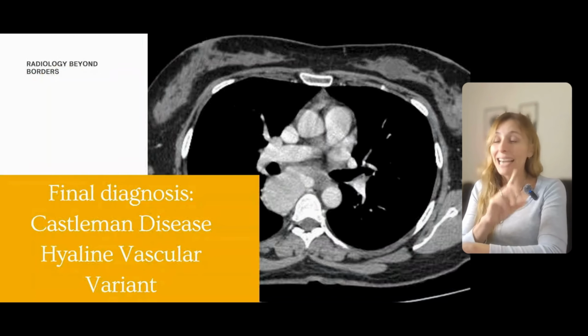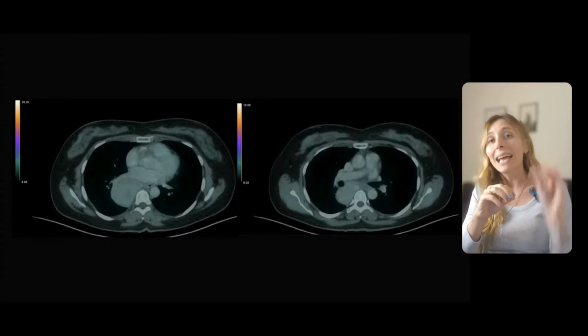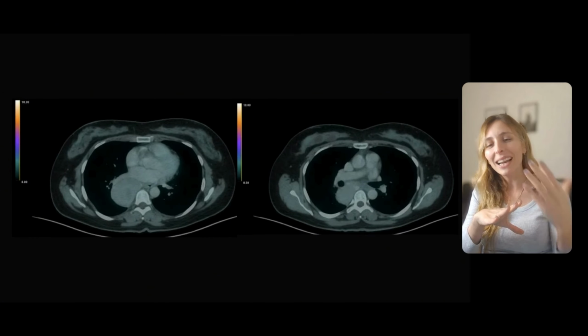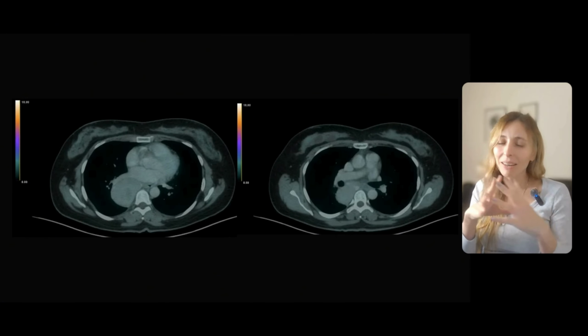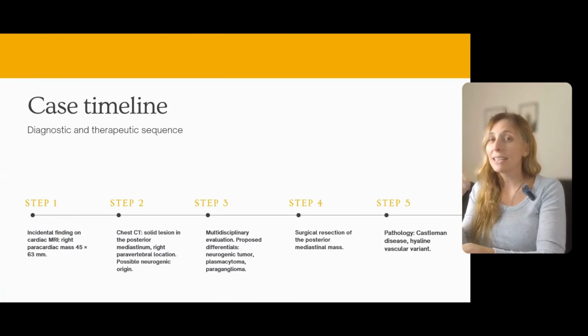And something that I did not mention to you that you might be wondering is that this PET-CT was done with gallium dotatate. So this was not metabolically active, because we did that thinking, being almost sure that this was a paraganglioma. And the result was negative, so the lesion was biopsied, and this was the definite diagnosis.